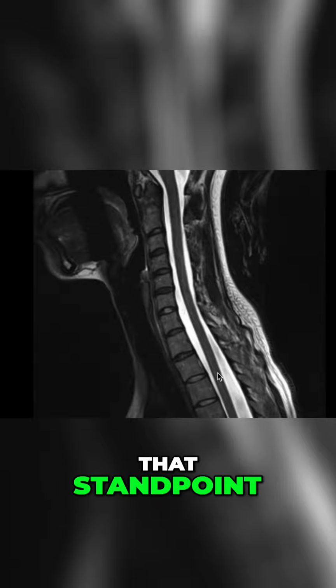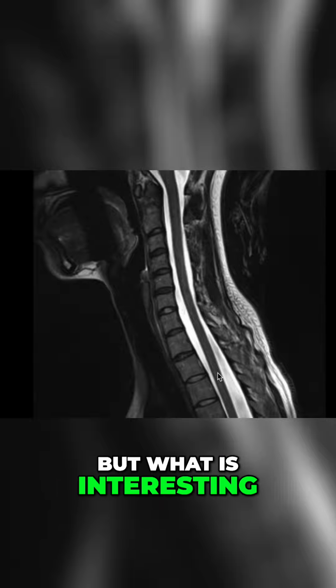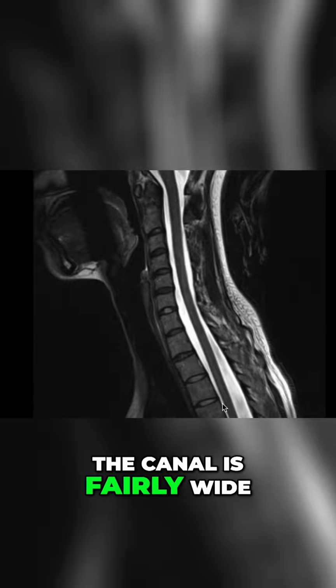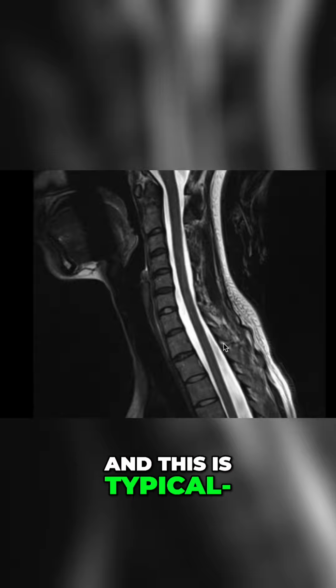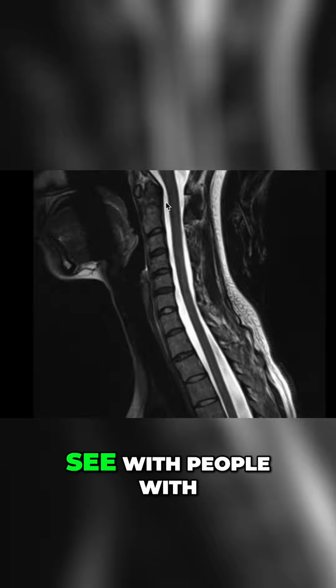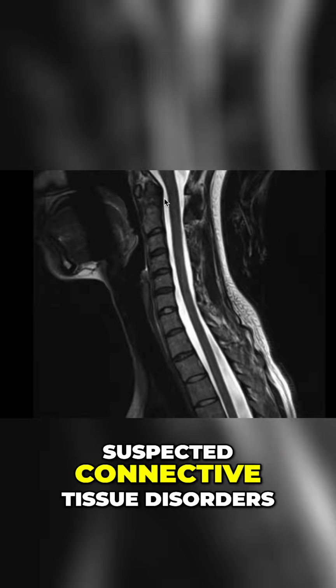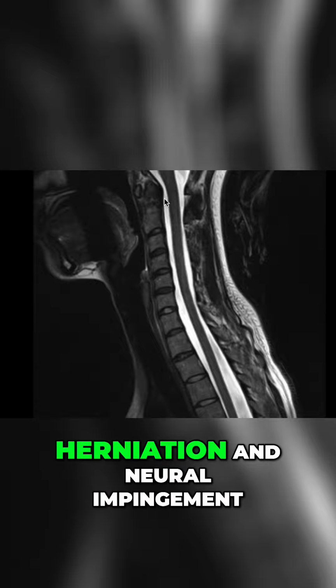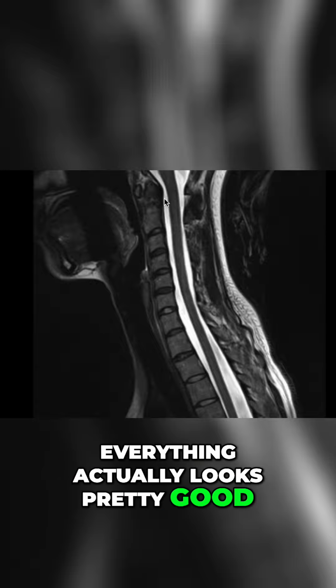Everything looks fine from that standpoint, but what is interesting is that the general size of the canal is fairly wide, and this is a typical finding I see with people with suspected connective tissue disorders. So outside of disc herniation and neural impingement, everything actually looks pretty good.